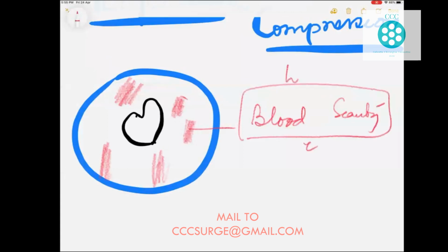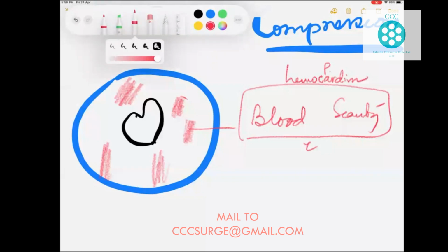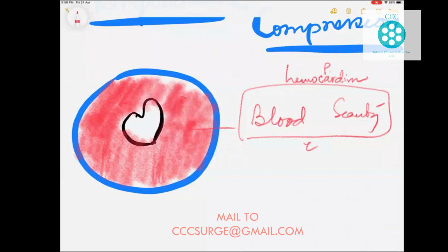That is hemopericardium, but definitely one of the causes of hemopericardium will be trauma. But for us as surgeons, remember that this is a surgery lecture. We are interested in the blood or liquid, doesn't matter, because in an accident you don't expect anything more to come except blood. The problem in a tamponade, as I have said, is the compression.